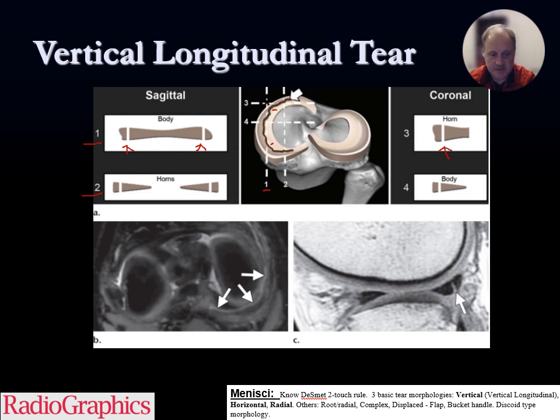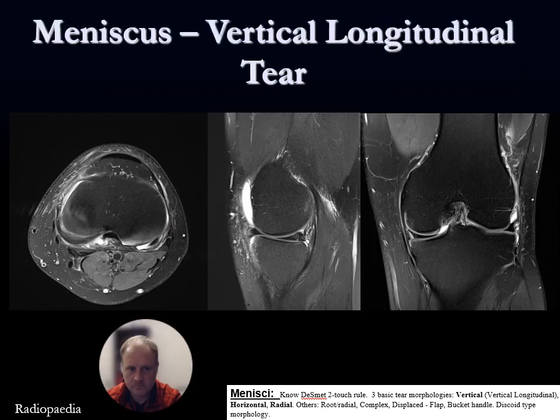It's a vertical signal that touches the meniscus and looks like that. The axial imaging can be helpful. I started using this more, and I think it can be very helpful, but if you can find one axial image where you find that tear having that vertical longitudinal orientation, it can be very helpful to know what you're looking at. Here are some examples of what a vertical longitudinal tear would look like. I think it's best shown at the body of the medial meniscus here, where you see this more vertically oriented signal. This is actually the peripheralmost part of the meniscus body, so this is all meniscus tear here, and kind of showing once again an axial image where that tear is right there.